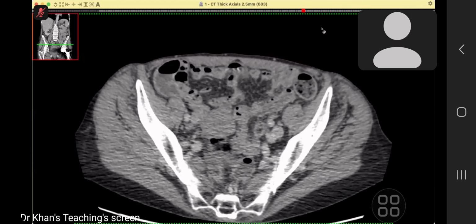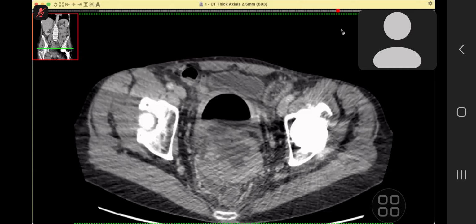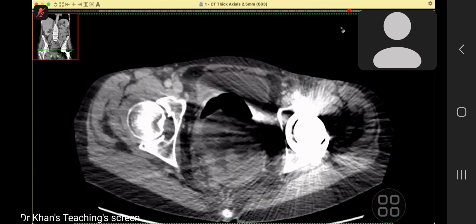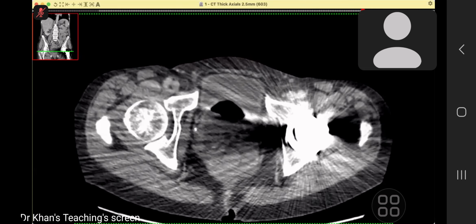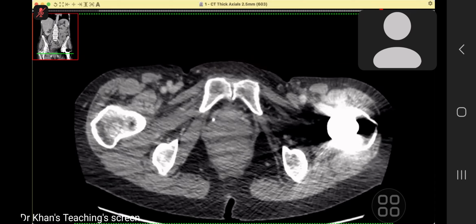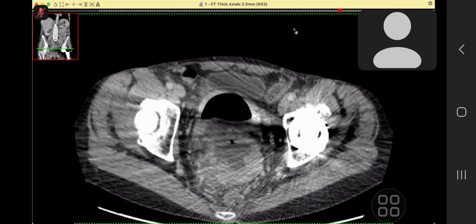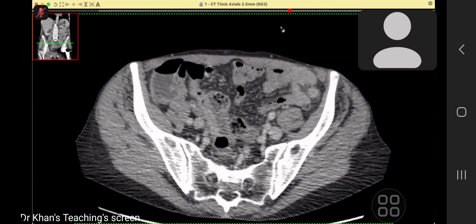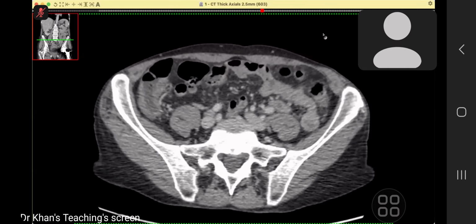There is a complex area, mainly of soft tissue component with a central cystic area, and an air locule seen at the level of the lower rectum and anal canal. The colon proximally is not dilated.